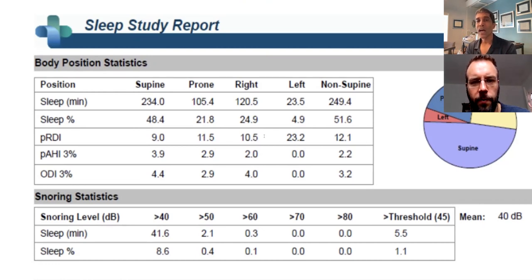So when I see this, I would suspect that this person has a right nasal obstruction of some type, deviated septum, or just massive nasal cycling that occurred at that time.